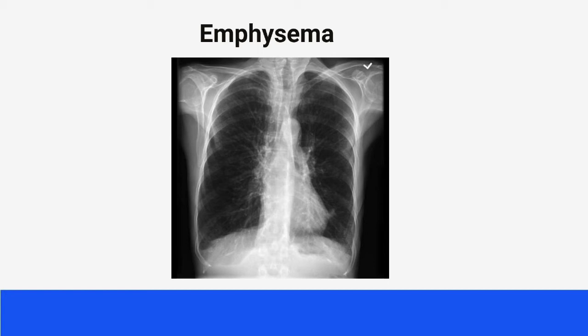The lung fields are darker, and the diaphragm is set low and flatter. The diaphragm is even set low to the 11th or 12th posterior rib. The heart shadow is compressed because of the hyperinflated lungs. It appears vertical and narrow, and there is presence of air under the cardiac shadow.